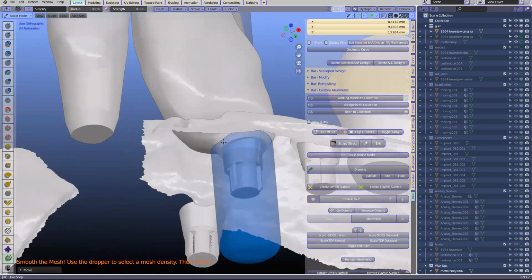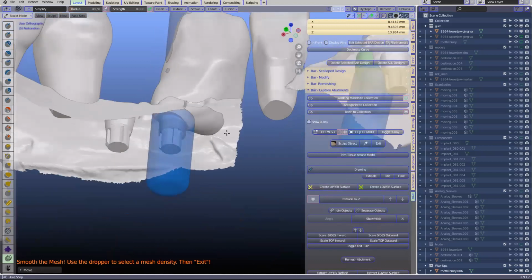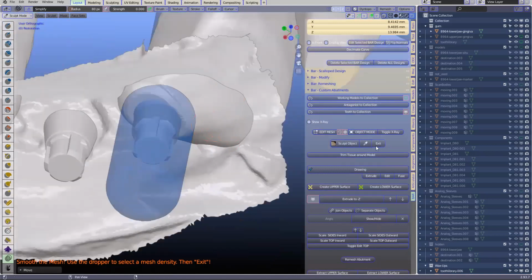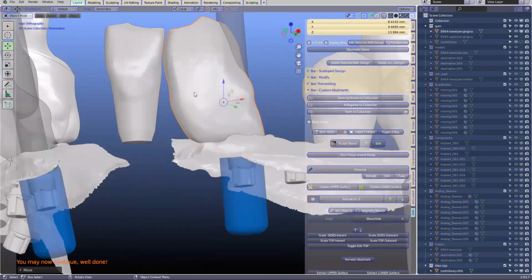So here, let's do that. Maybe it would be good to have a heat map, so you can see how thick it is. I don't know, just off the top of my head, maybe not.